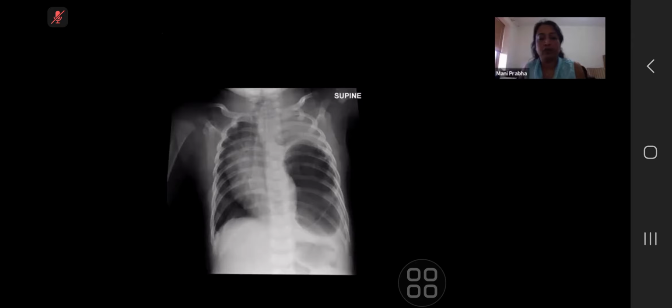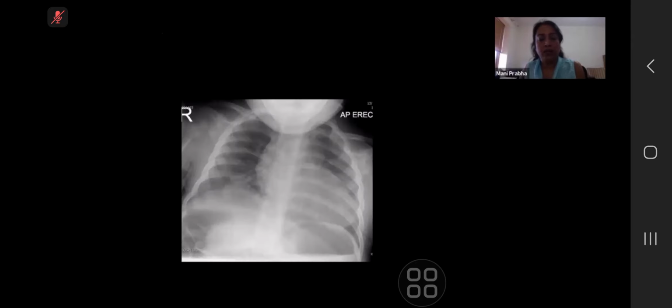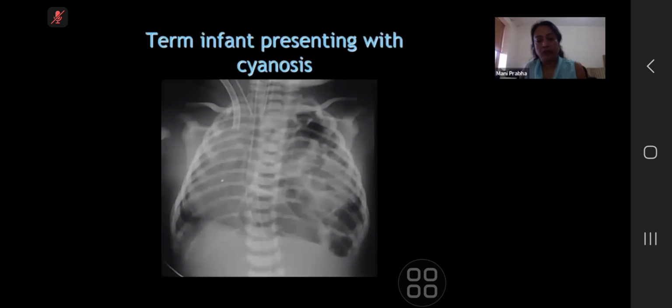And if you can confirm the diagnosis at this point, the patient goes straight for surgery. Usually they are associated with hypoplasia of the ipsilateral lung, because the lung hasn't had the chance to develop completely in the antenatal period. So this was the post-op X-ray of the same patient. This is the next one for you, and then I'm going to sum up all the findings.